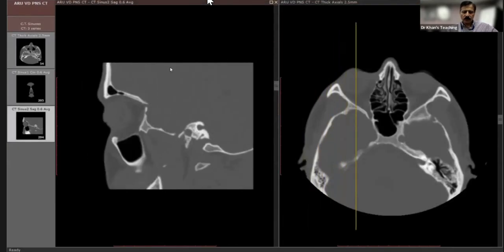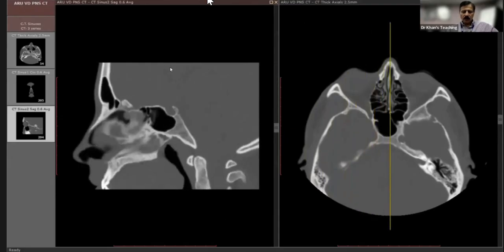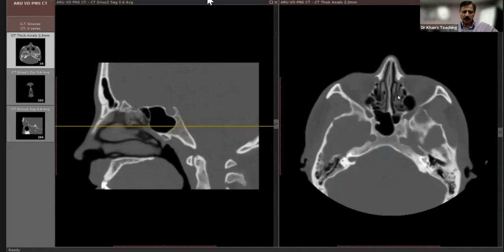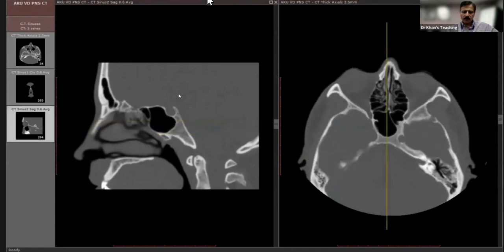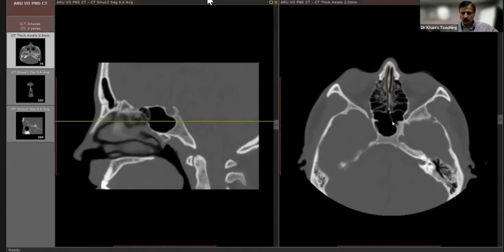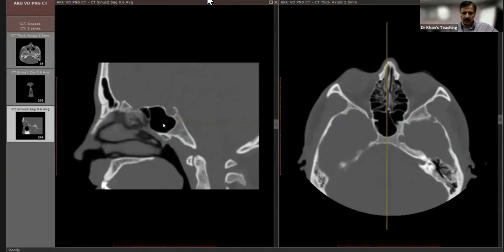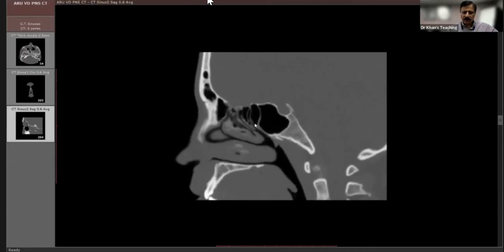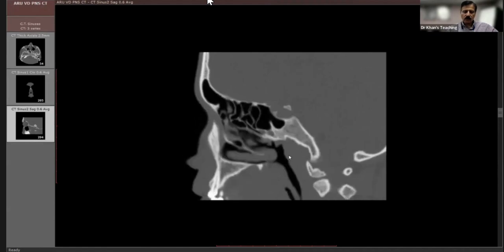and try to orient it. Actually, you can see it very well. You see this thing? You see this ostium here, which correlates with this thing. So this is the ostium of the sphenoid sinus. And so from here, the secretions will come here. We are at the midline. But then if we go slightly medially, we can see it will go into the nasopharynx.